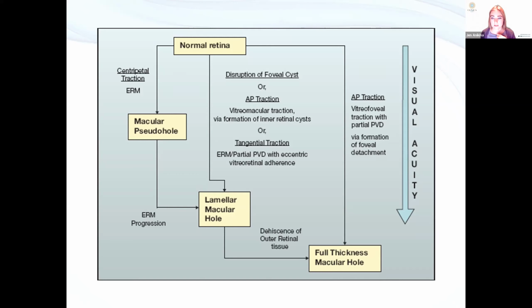So, a young patient with ERM and a slight drop in vision: yes, always assess for tears. Every ERM, assess for tears, because if you pick one up, that's brilliant. That's an earlier pickup and we can look at it. But in the young, you're much less likely to have a PVD in situ, although you might still have a PVD. They might be myopic, or they might have had trauma, or they might have had inflammation, all of which will induce an earlier PVD.